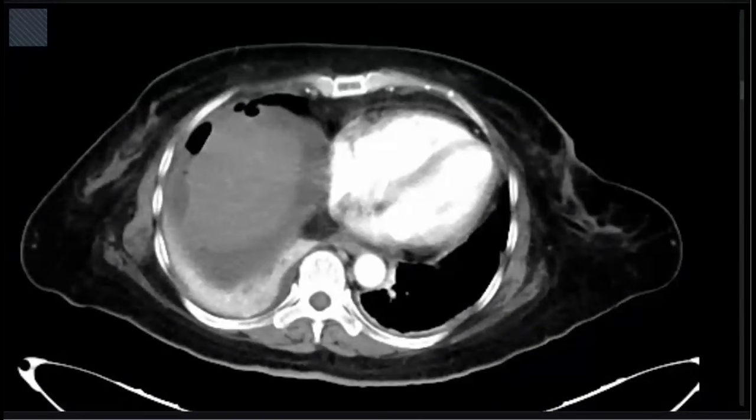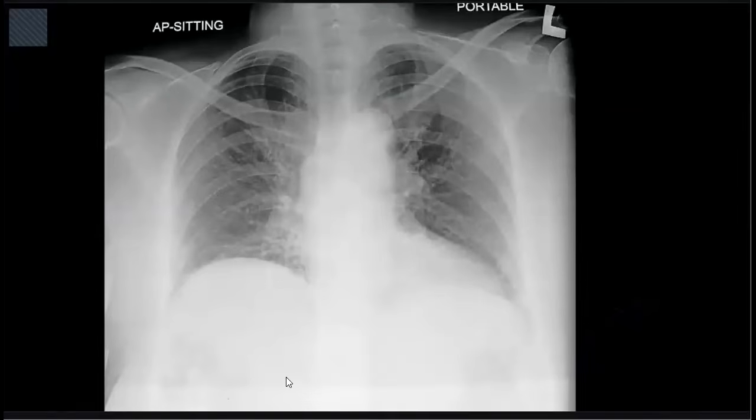Okay, this patient, plain radiograph. An old-age patient, with no significant abnormality. As you described, the lung fields appear to show some reticulation, but it is not important, likely the vessels. This patient is sitting, with a portable X-ray, so she didn't take full inspiration and both lung fields appear small. However, the cardiac shadow is not much enlarged, except for the aortic shadow. The hilar shadow is also acceptable, no significant abnormality. Costophrenic angles appear clear.